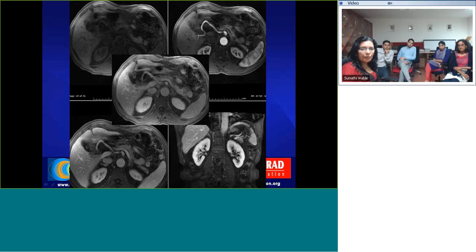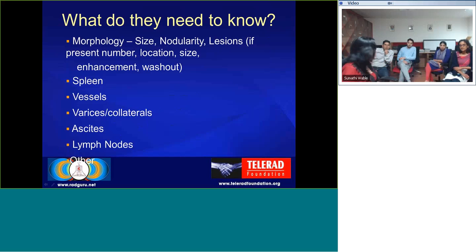And then pre-contrast, arterial phase, portal venous phase, and while waiting between the portal venous phase and the delayed 5-minute image, we also started doing coronal images, because we realized that your eyes don't pick up certain things, like we missed a few left lobe lesions for whatever reason. So this was another plane we added while we were waiting. And these are all breath-hold images, usually taking about 15 to 20 seconds.